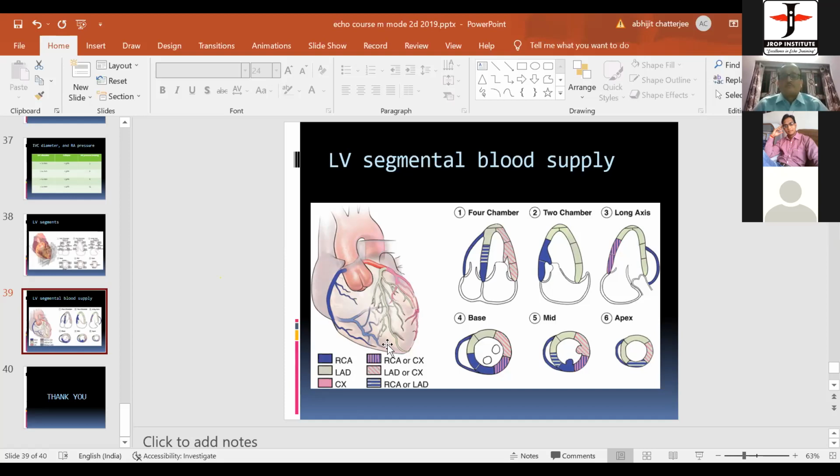Yes, sir. Dr. Jaising, Dr. Abhijit has very categorically said, yes, sir. Proximal RCA involvement means looking at the RV free wall. Right, sir. You have an inferior wall MI and you have the RV free wall hypocontractile. And then you can have dominance or non-dominance based on associated lesions.